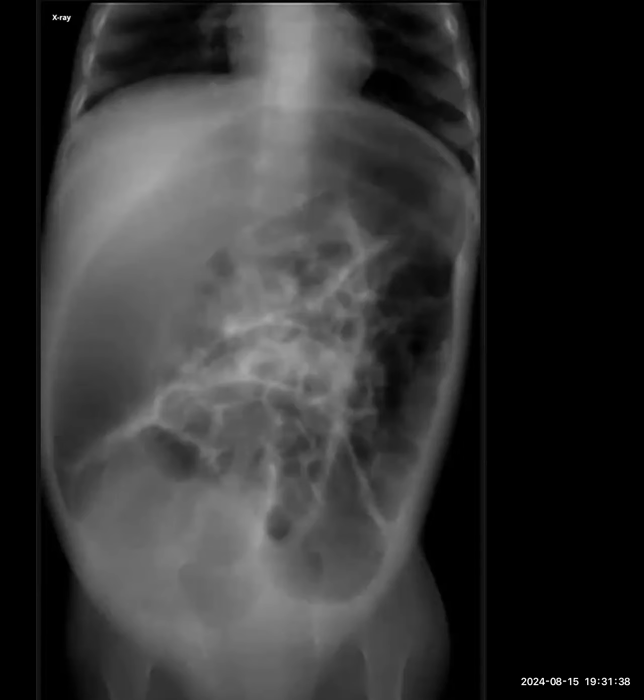Okay, I am presented with a frontal radiograph of the abdomen. I see there is a large distended bowel loop which is peripherally located, and I can see there are multiple small bowel loops in the central part of the abdomen. This peripherally located loop is mostly occupying the right upper quadrant.